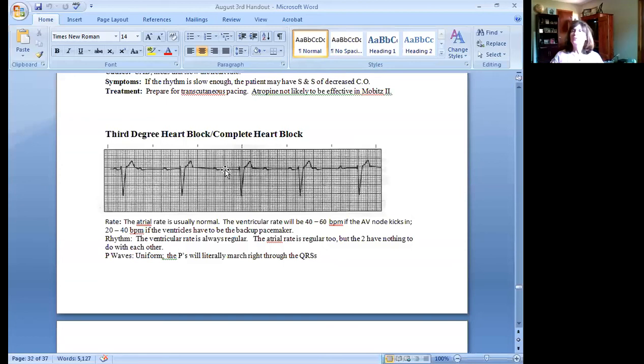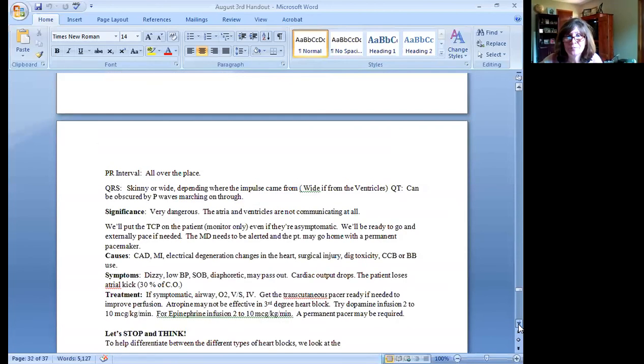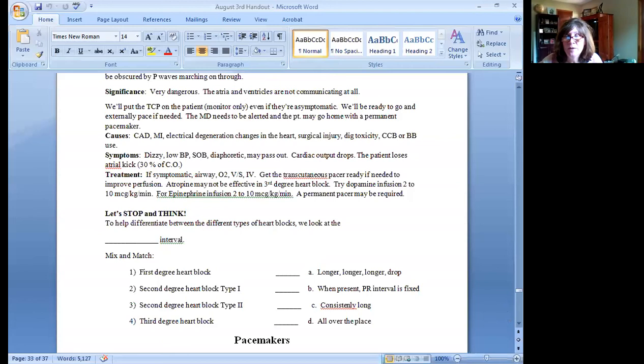You are not responsible for knowing heart blocks or the pacemaker rhythms that I'm about to show you. But in clinical, you're going to see pacemaker rhythms, so I just want to give you a heads up. But before we get to that, let's finish talking about third degree.